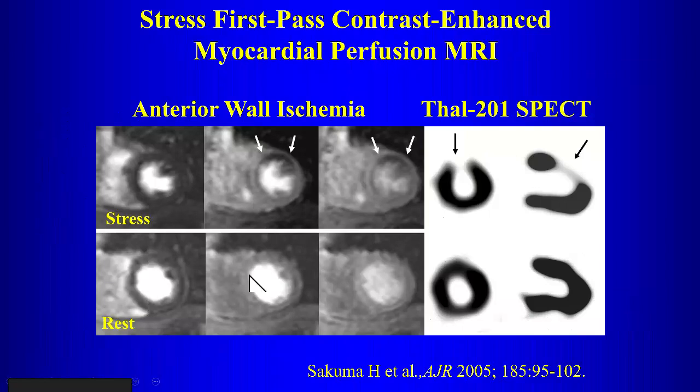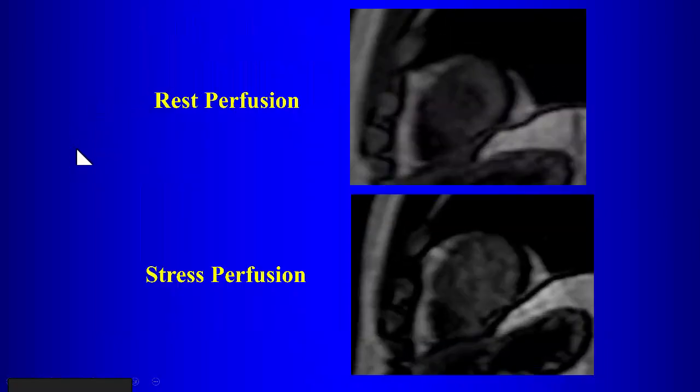So under the resting condition, normal perfusion, you don't see a defect. Under the stress condition, there is a perfusion defect that is a reversible defect here. So this person has ischemia within the course of what vessel? And here's the SPECT, the thallium study. LAD, right, so that's an LAD, so you would expect a tight lesion somewhere in the LAD distribution, okay?